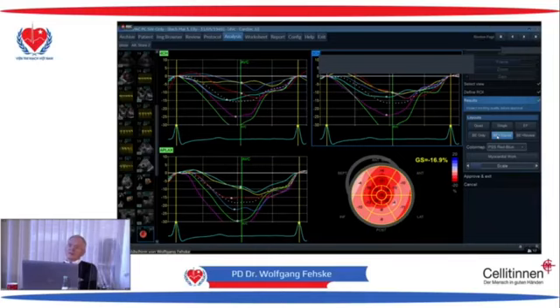This looks extremely like amyloidosis. And this is what we do in these patients. She has the age of that. She has no reduced EKG amplitudes, but we must exclude amyloidosis by electrophoresis, that she has no paraprotein, and one could do in that patient a scintigraphy today, but what we do is a biopsy during the operation later on.